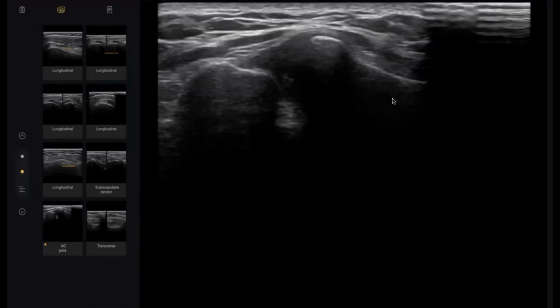Do you know the most critical or most dangerous type of acromion that causes tear? Type 2? No. Sorry. Type 2 is a little bit borderline, but not critical. What else? I'm not sure about it. I think this question also came before. I've forgotten. Type 3 and 4.